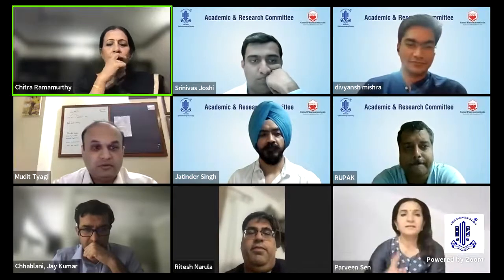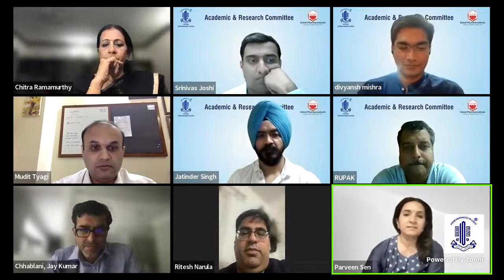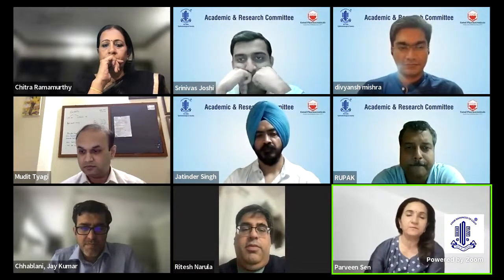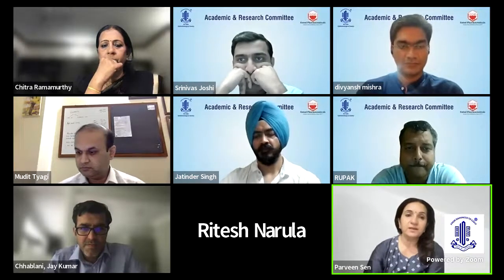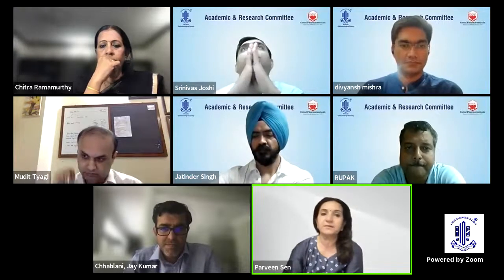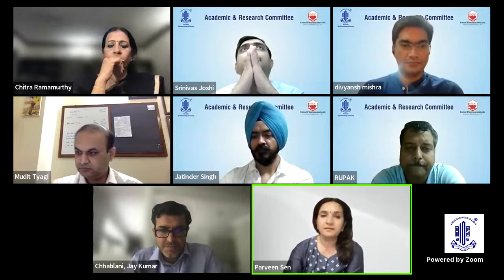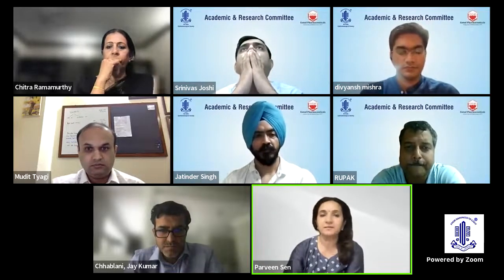Yeah. So I'll make a comment, quick one. Just like Ritesh mentioned that we can look at the RPE fit, but sometimes the example which Rupak showed, which was in case of MacTel, those are the ones which have those new vessels very close to the pigmentation, or they can have it in the avascular slab. If you just use the RPE fit, you may miss them. But again, as Jay mentioned, 1 or 2 slabs you need to identify and look carefully at that.